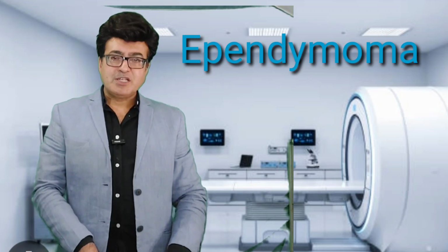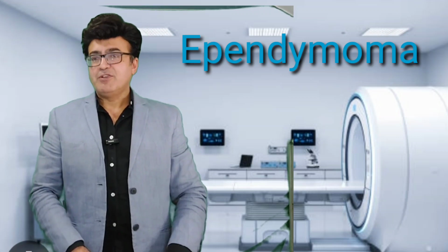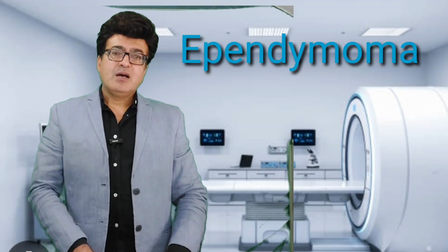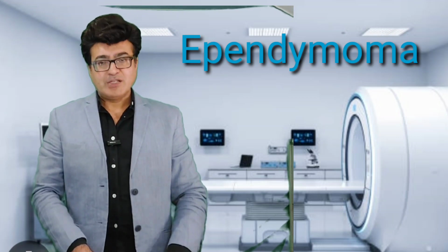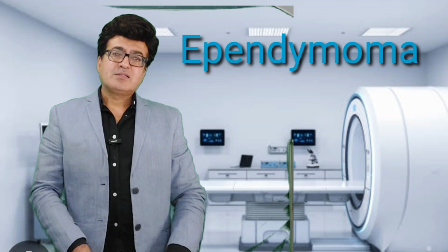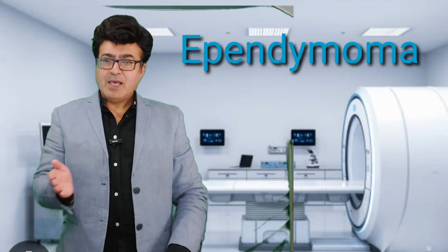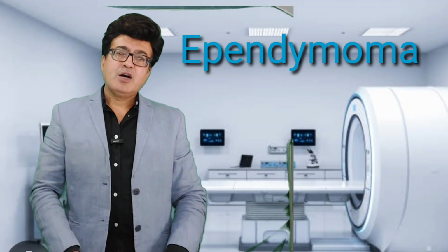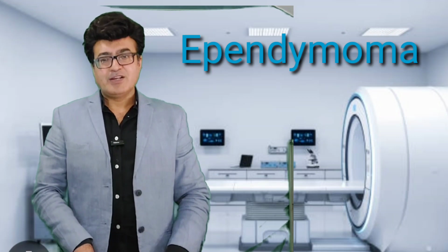In case of supratentorial, it will be adjacent to the ventricles or in the periventricular region. In case of infratentorial, it will be within the ventricular system. A subgroup of the ependymoma would be cerebral hemisphere ependymoma, which will usually involve the lateral ventricle and the trigone of the lateral ventricle.